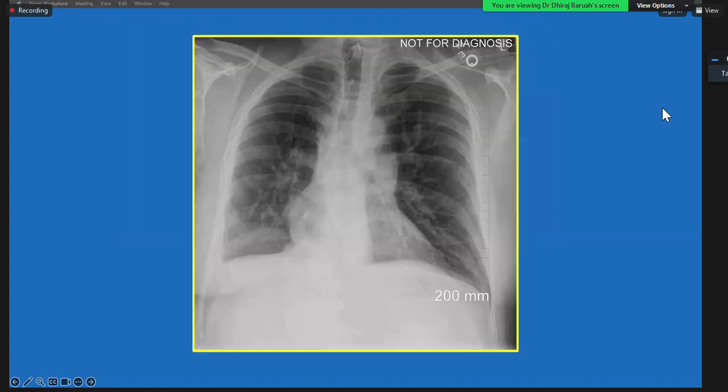Coming to another abnormality. If you look at these heart borders, you see on the right heart border there is something not normal. If you know the normal structures, you see that this is not normal. And you know that on the right side, if you see something abnormal like that and the patient is asymptomatic, you worry about abnormal pulmonary venous return. You look at all the outlines, lines and stripes, and you see that this is not something that should be there. Also you see some blunting of the costophrenic angle, so there may be a small amount of fluid.